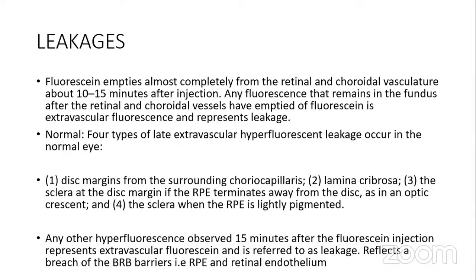Okay. So when the RPE is so lightly pigmented and thin, you may see the staining of the choroidal tissue. So when you see some patients that have high myopia, and you see that you have diffuse chorioretinal atrophy, and some persons, even when they have healthy tissue, if you look through, you can see the sclera show.